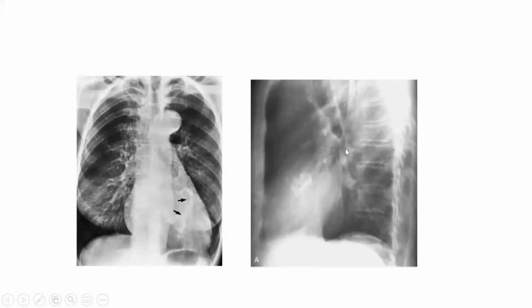Let's do this one in the lateral X-ray. The hilum is here, and I'm taking a line to this angle. So I have a density that's above this line. So this density most likely is what? This is aortic.